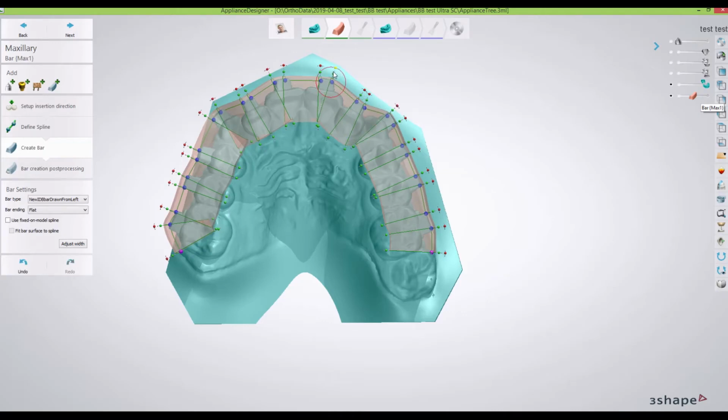And a lot of times you don't see it, but in cases where there's more of a malocclusion, more crowding, you may see that overlapped area. And I like to start here just to eliminate those. One, so I remember to do it, and two, sometimes it'll affect the shape on the front. So I like that.